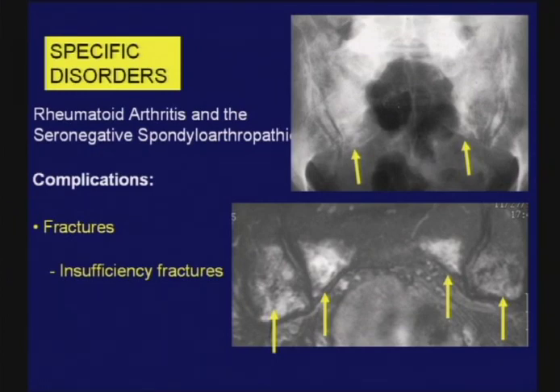As shown at the top right image, the typical thing we look for with the insufficiency fractures of the sacrum are bands of sclerosis on a plain film. They are often oriented in a top to bottom manner, and you can sometimes see the breaks in the cortex as well, but often there is gas overlying this area, so I'm sure we miss a lot of these.